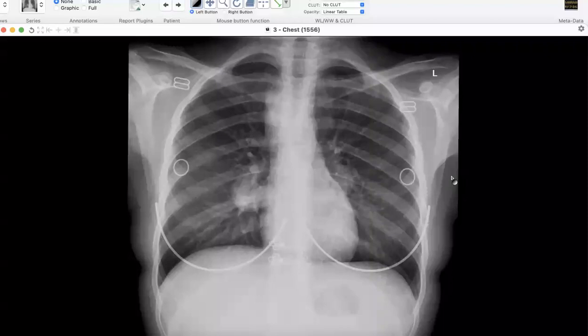Like I said, this is a teenage female patient, so you have to justify the CT in this age group. Well, actually, it is well defined in outline, and I just learned that she's a teenage patient, so it could be a vascular malformation or AVM. However, AVM is more peripherally situated, but this is more central. So it could be vascular again or some malformation. So that's why I need CT or CT angio just to be sure of this abnormality much better.